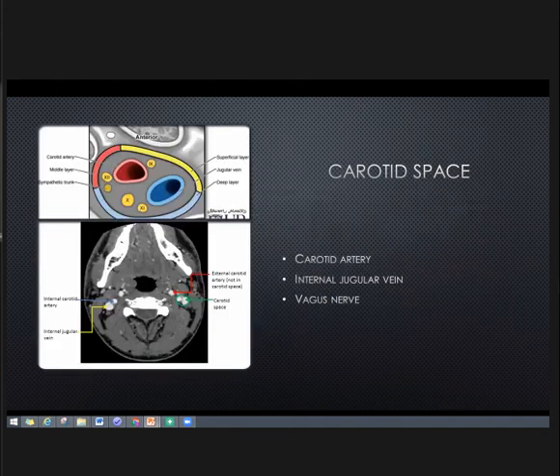The carotid space is a roughly cylindrical space, as shown here by its shape. It is also circumscribed by the carotid sheath and from all three layers of the deep cervical fascia. Above the carotid bifurcation, the contribution of the middle layer of the cervical fascia and the sheath is interrupted. The carotid artery bifurcation occurs at the level of the hyoid bone.